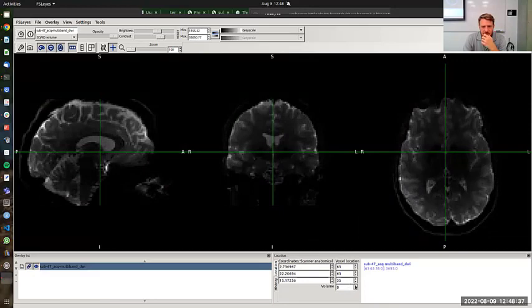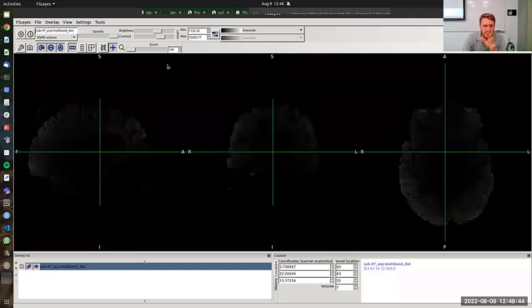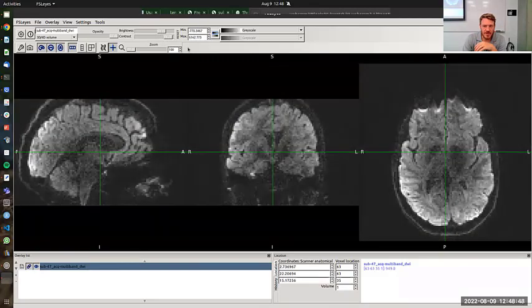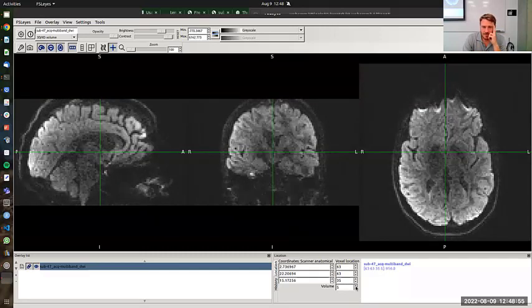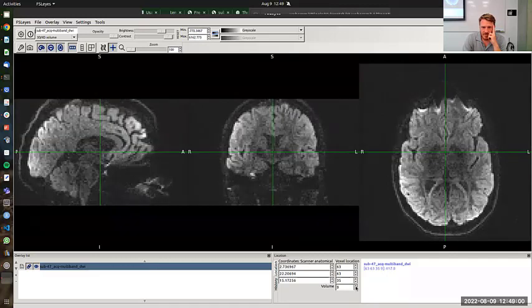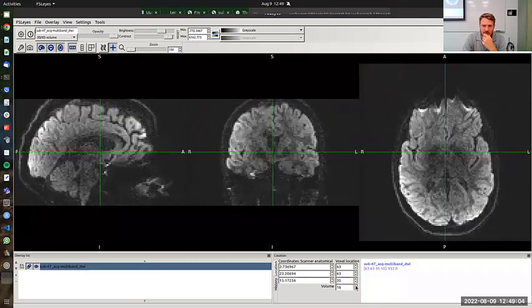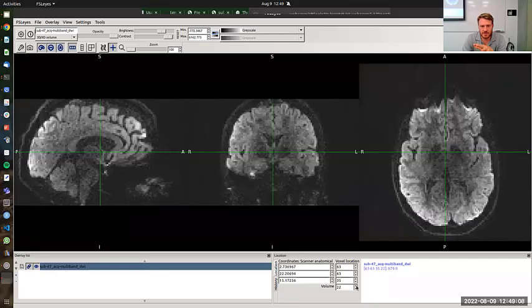Okay, so we're going to have interspersed those b=0 images, which are going to be brighter. So as soon as I do that, we need to change the contrast again. Okay, so this is going to be fun. As we go through the different directions, we're seeing different diffusion restrictions, and so signal dropout, and so on. And instead of 3 directions, this DTI was obtained in many directions.